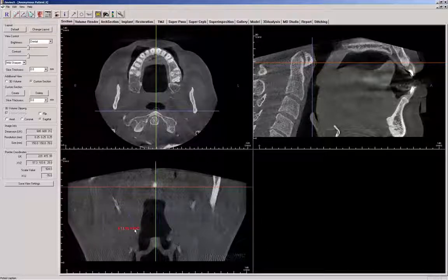Let's move to the annotation tools, which will give you the opportunity to draw attention to any details within a slice. The arrow notation allows for an arrow to be drawn on a rendered image. Just mouse click where you would like the staff of the arrow to begin, then move your mouse to the area of interest and mouse click. You may move the arrow by left mouse clicking on either endpoint and then while holding the button down, drag your mouse. Mouse click away from the point to lock in your changes.